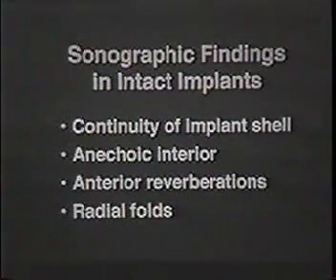An intact implant should have continuity of the implant shell. It should have an anechoic interior. It may show anterior reverberations. This is not abnormal.